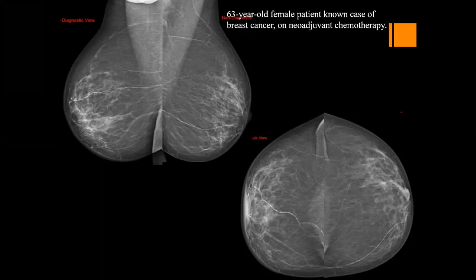Do. Heidi? Yes, yes, you are right. Why was it reported or coded as 6? Yes, you are right. There is a response to the chemotherapy.